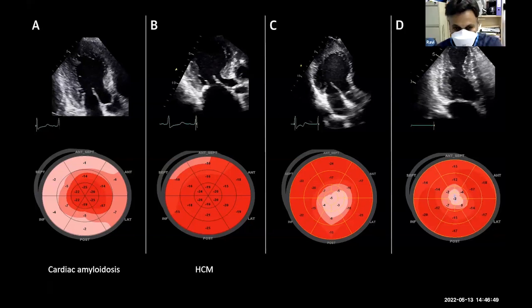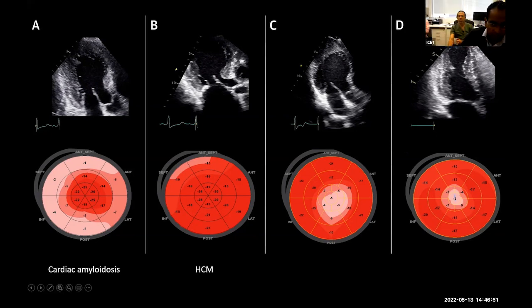What about in panel C? Takotsubo? Not quite. In Takotsubo you get a blueberry on top pattern, unlike cardiac amyloid where you get the cherry on top. Look at the B mode image. What about whether that's thrombus sitting at the top of the apex? Could be apical hypereosinophilic syndrome. Yeah, Hatem, you're quite correct. So it is a variation of HOCM, the apical HOCM. It's a bit difficult to see on the echo still image, but you've got reduced strain in that segment in comparison to the rest of the segments.